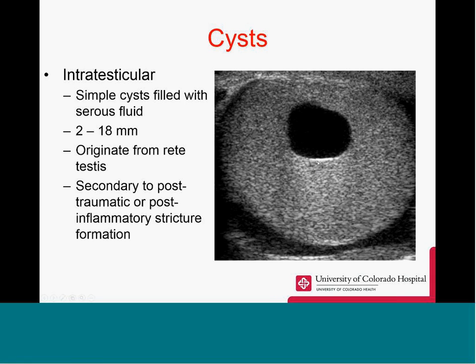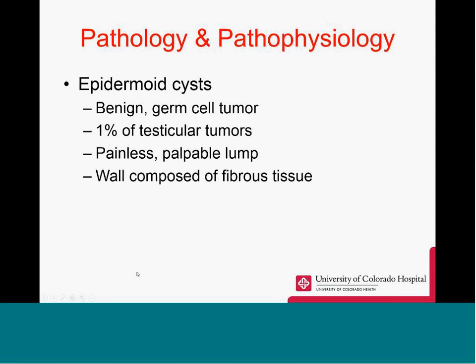Pretty classic cyst. It's round, anechoic. We have through transmission, posterior enhancement. There's epidermoid cysts. They are a benign germ cell tumor. Pretty small percentage, 1%. They are a painless, palpable lump within the scrotum, and their walls are composed of fibrous tissue.